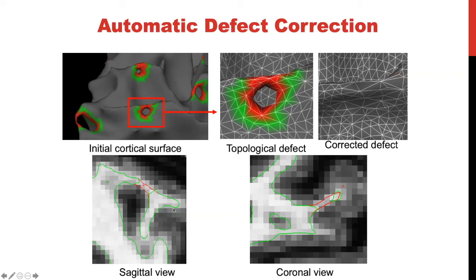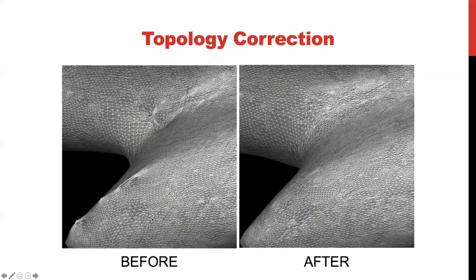This gives you a good tool to analyze your images in the 2D view. All you really have to do is add the voxels in to get rid of this hole. When you make those changes, you will see that your surfaces are way cleaner, way smoother.